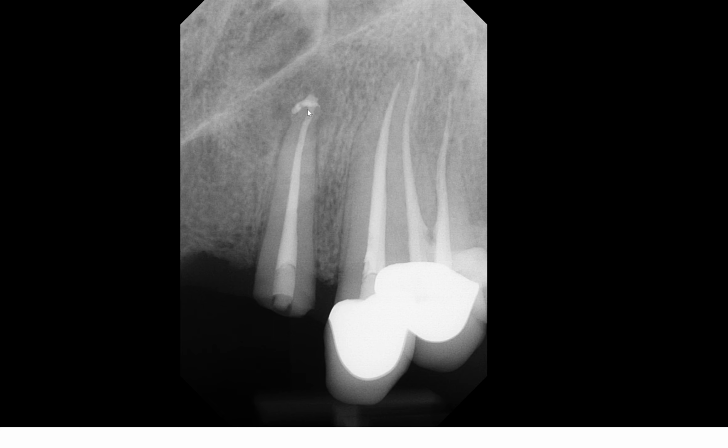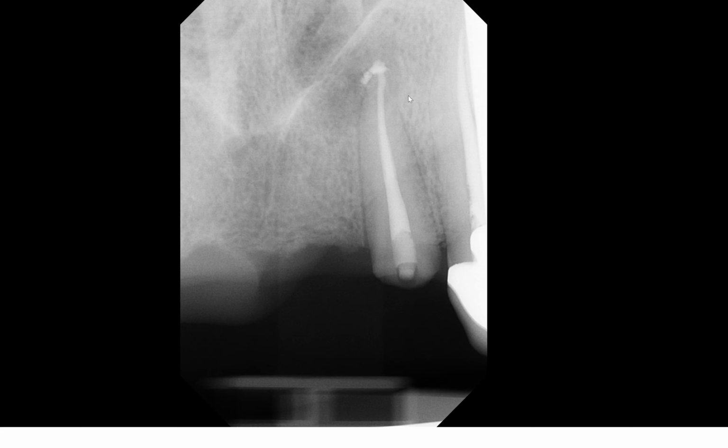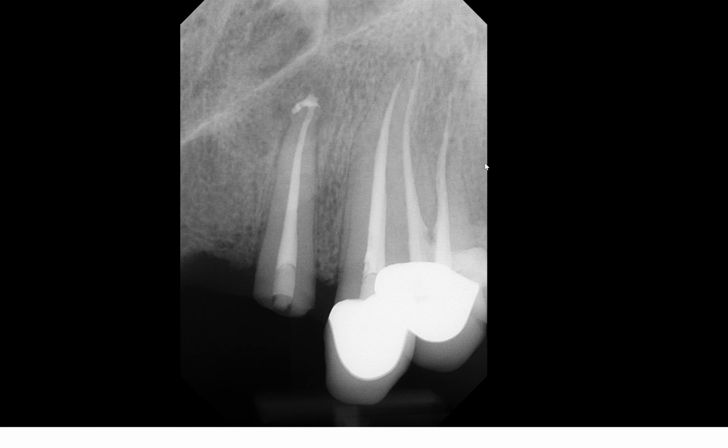Well, I'll give you another radiograph, another projection of this area. It might help you to determine. So let's go over to this side. And obviously, tooth number 9 is missing. But where is the mesiodens? It's a tough one, okay? But you have to look really carefully to determine it. Let me go over to the next one more time because I think the other one is a little bit more telling. Okay. In order to answer the question, we have to identify some normal anatomic features.